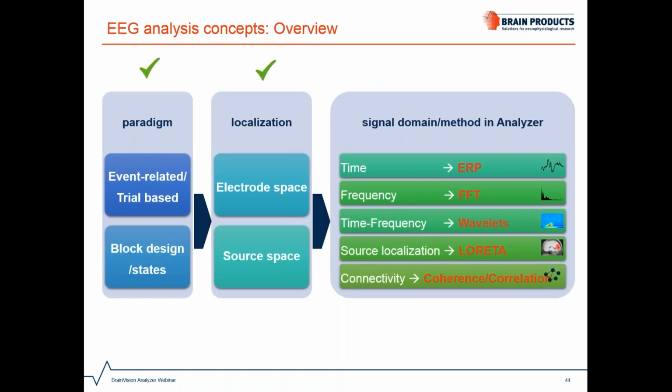Knowing some basics about paradigms and electrodes or source-based considerations, let's talk about the signal domains and associated analysis methods as implemented in Analyzer 2. We start with the time domain analysis in event-related paradigms and how to get to the event-related potential.